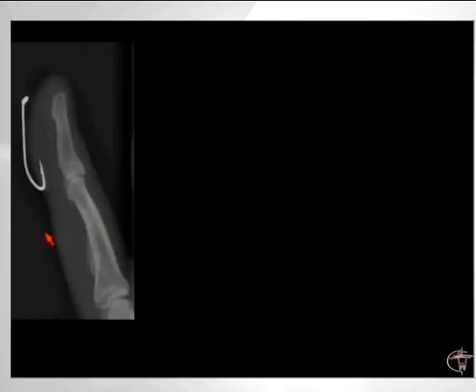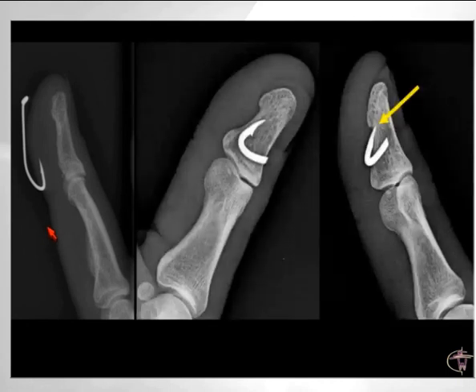Fishing can be dangerous also because fishes are hooked with metal hooks. If the fish hook is in the superficial soft tissues, like in this case, it's no big deal and it can easily be removed. However, if the fish hook is embedded in the bone and may affect the flexor apparatus of the hand or the fingers, then it is more complicated and may require surgical removal.